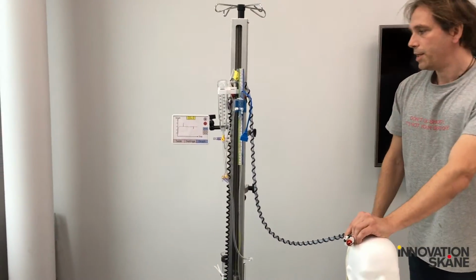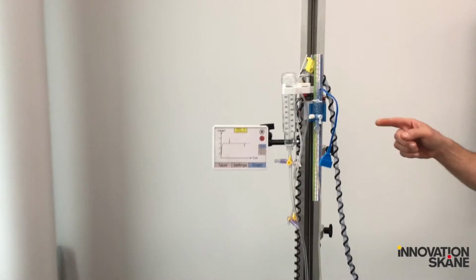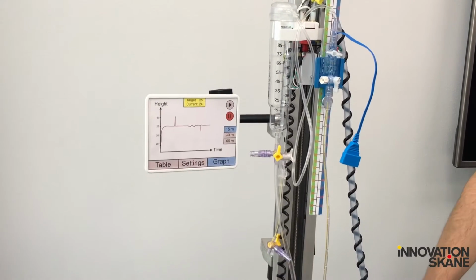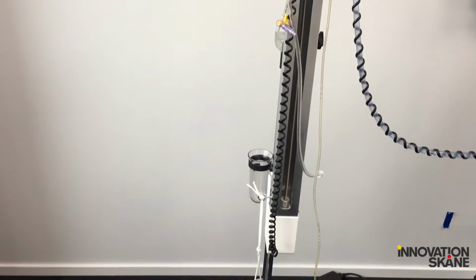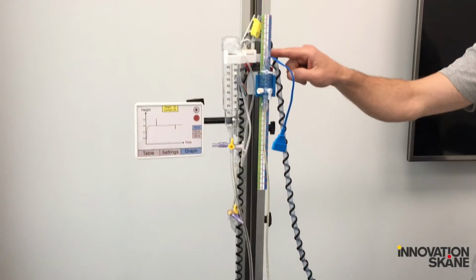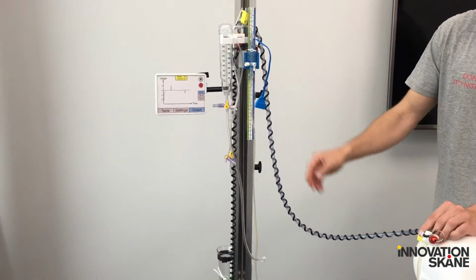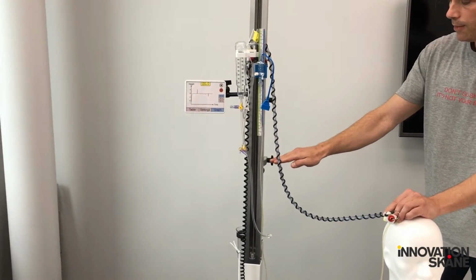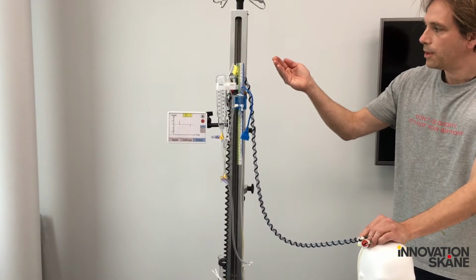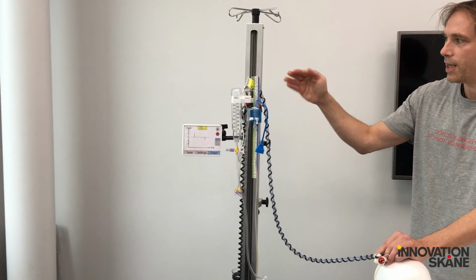And this automatic regulation of the height, the difference in height between the patient's head and the outlet of the drainage, is accomplished by a microcomputer which senses the pressure at this end of the tubing and at this end of the tubing at the same time. And the microcomputer is then of course connected to a motor which pulls the outlet drainage to the height which it has been set to maintain.